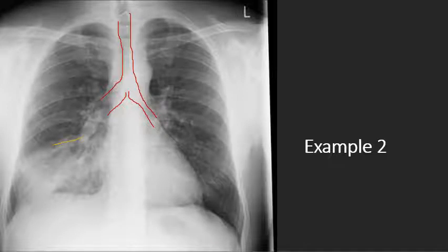This is bad. So this right here is a lobar distribution of an infectious process, most likely an infectious pneumonia. And so this individual had a lobar pneumonia, and you can see costophrenic blunting right here, okay? And so this patient's got a pneumonia.